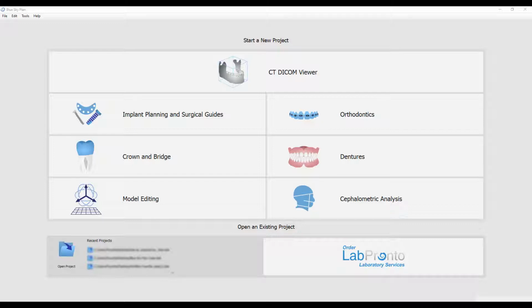Well, today we are planning a case of a right mandibulectomy with an immediate fibula, immediate implants, and immediate teeth. And what we're showing here today is how to create the dental prosthesis. And this will be using the floating prosthesis style, which I'm going to show you.